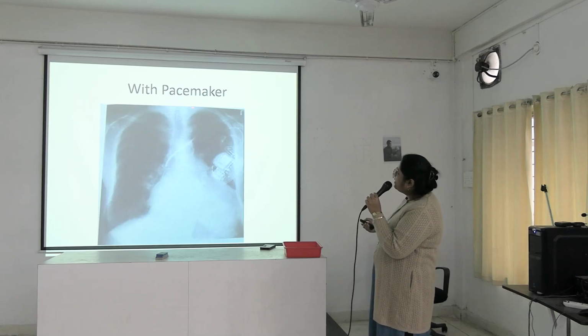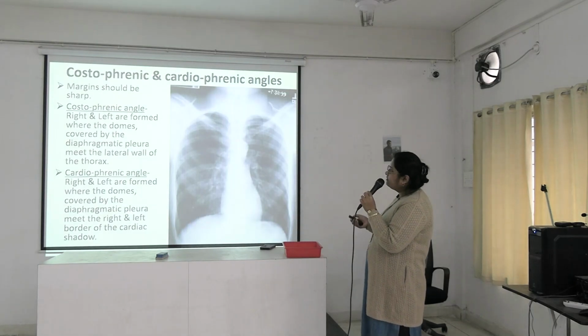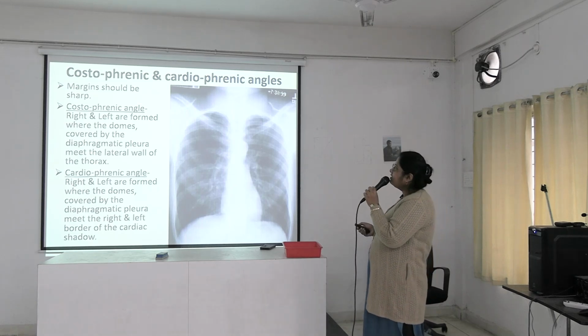And this is a chest X-ray with a pacemaker. It will be visualized like this. Next, two angles. These two angles are very important, very frequently given in your OSCE.